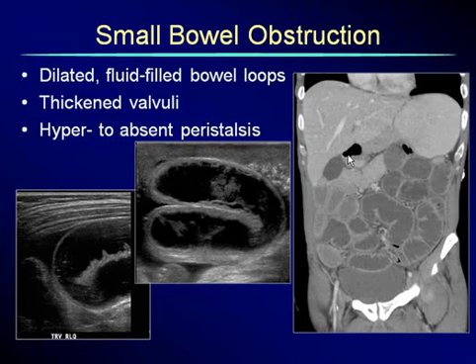It's not getting through. The fluid is backing up. All these secretions that are coming down from the mouth and stomach, etc., build up. And then the gas gets burped out or absorbed or passed, and the bowel continues to fill and fill with fluid. That's the kind of bowel that we're talking about here.